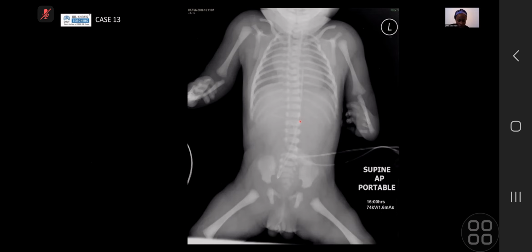And you can see here at the sacrum that there's abnormality at S3, 4, and 5. So you've got what looks like S4 fused to S3 with only half the vertebral body present at S4. So it's probably a hemivertebrae that's fused to S3. Anorectal malformations are also associated, so that's the A in VACTERL, and that's often diagnosed clinically by the surgical team or the neonatal team when they do their baby check.